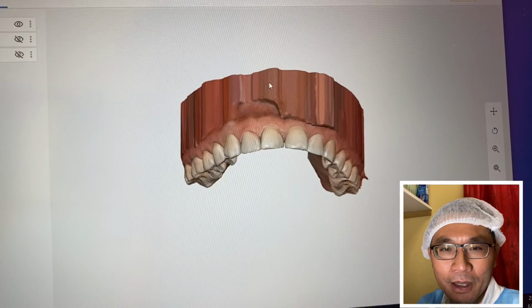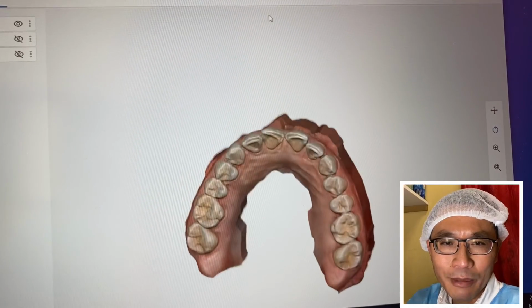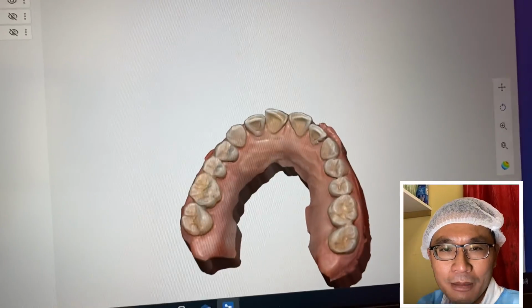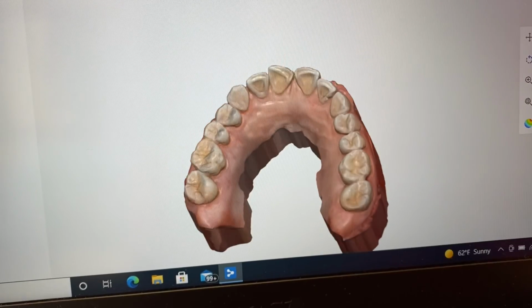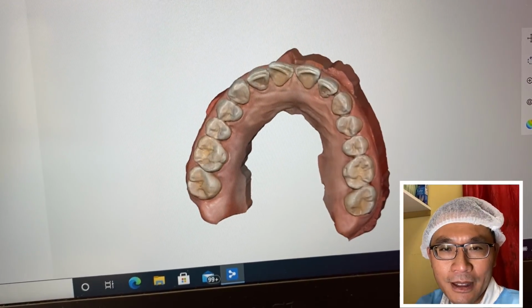Utilize technology, you'll enjoy it. Anyway, I'm using the Medit500 and I love it. It's a great tool for case presentation, especially orthodontic treatment, in this particular video, study model presentation right on the same day.